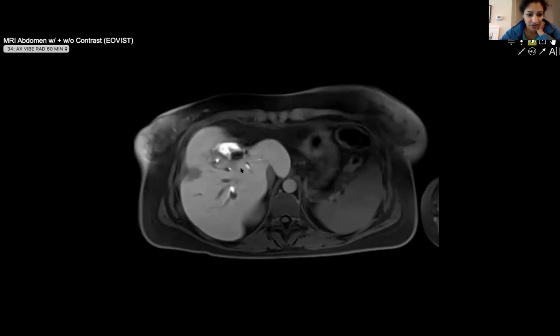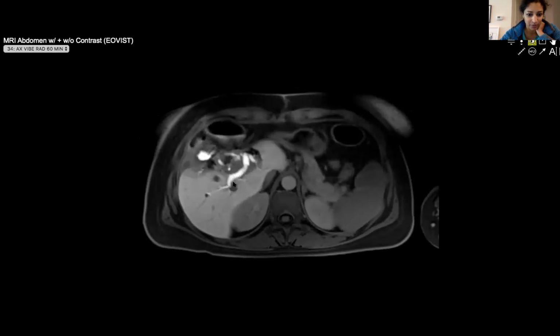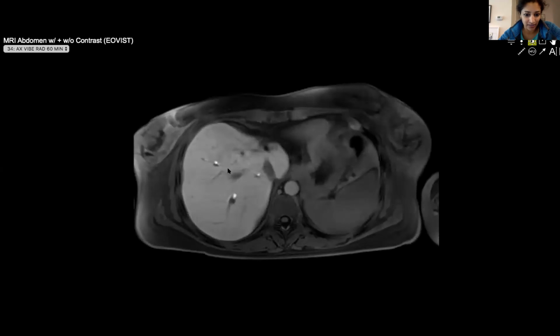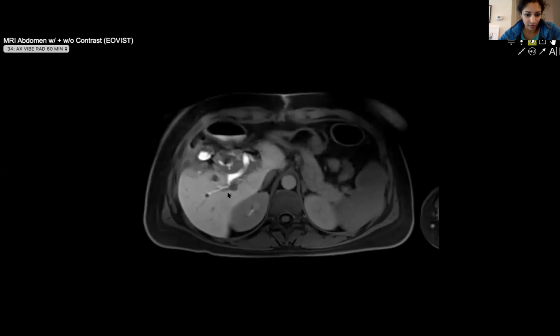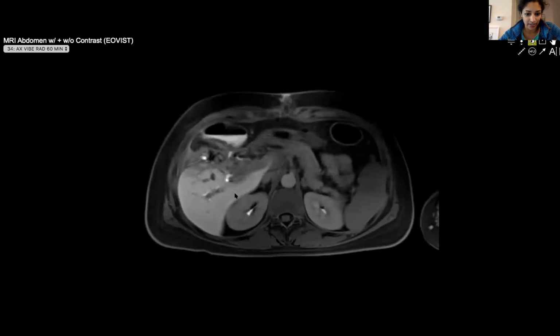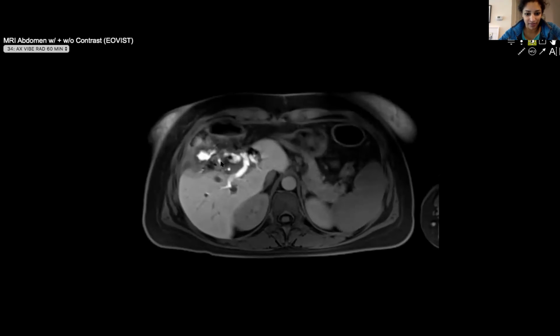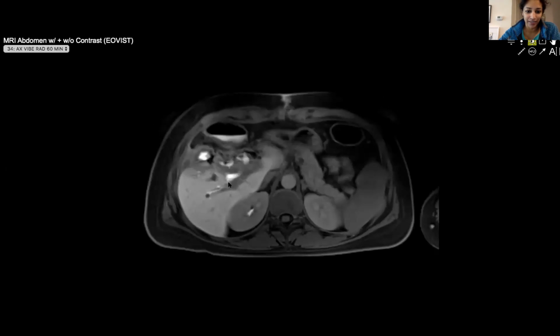But another important factor here is that that's basically the posterior duct. So we wanted to see what was going on with the anterior duct. And you can see here that actually these are segment 8 ducts right here. And they're also potentially going directly into the biloma. So it looks like we didn't see a connection with the posterior or the segment 8 ducts with the posterior duct. So potentially they're going to have to reconnect a piece of jejunum to both the right bile duct as well as these 2 small segment 8 ducts.